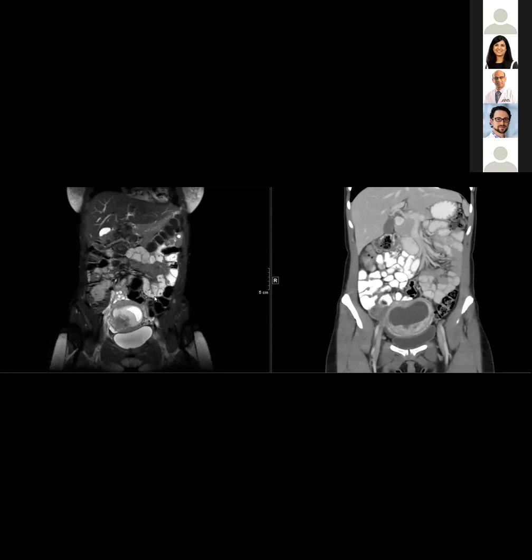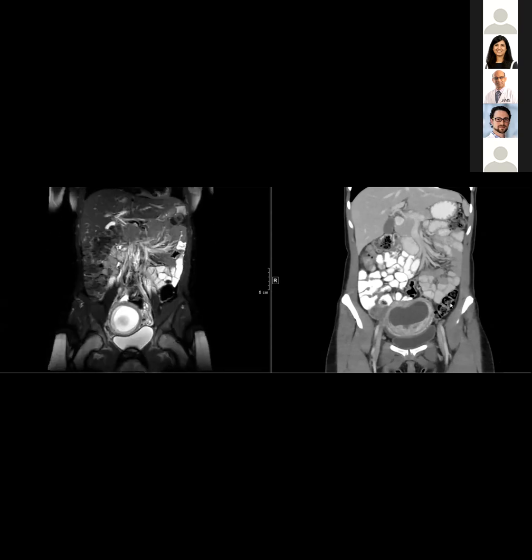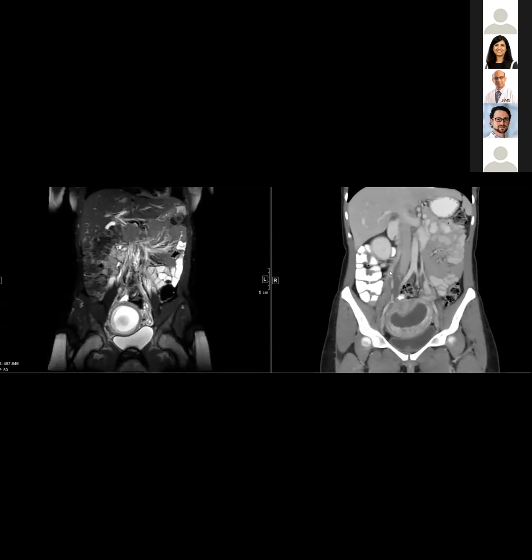Well, yeah, except, okay, so you have to accept, right? This part is opacified, right? So if this part is opacified, that means that there is reflux, right? Reflux, agree? Exactly. So which means that if this is reflux, then this has to be thrombosed, right?